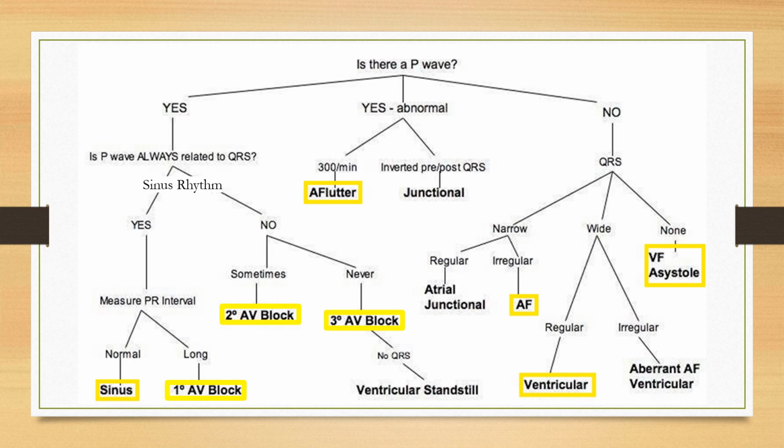Okay, so really figuring out rhythms starts with the P wave. Yes, there's a P wave. No, there isn't a P wave. Okay, and then you follow it from there. So, as you get used to this, it actually is a lot of fun to do this, and you can get very, very good at it. And you can determine a rhythm very quickly once you practice this. Okay, I hope this helps.